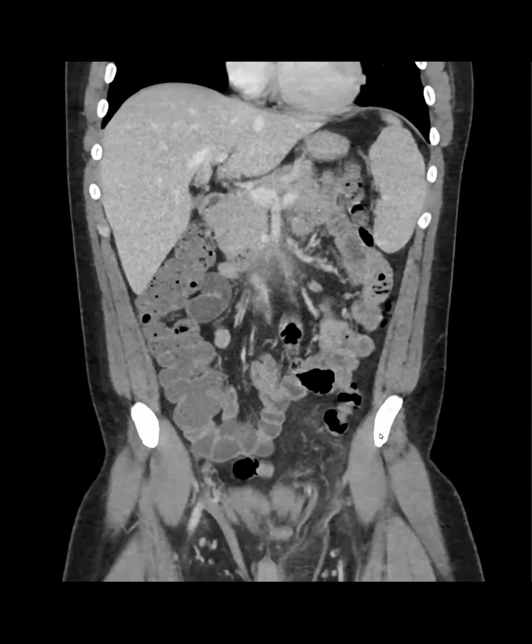So this is interesting because you guys all jumped on melanoma. Here's a liver met. When I was in the Bronx, I think I saw 3 cases of melanoma the entire time. And the gallbladder mets we saw, the few of them, were from renal cell and lymphoma. But since I've been at BI, they're still rare, but we've seen many more melanomas and many more gallbladder mets. Kind of interesting.